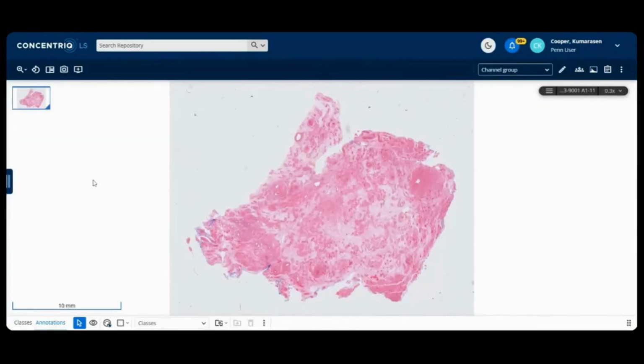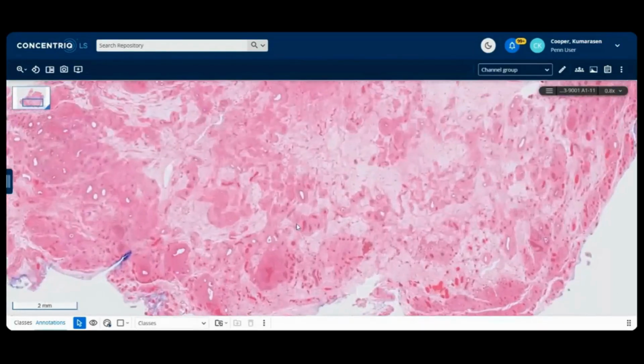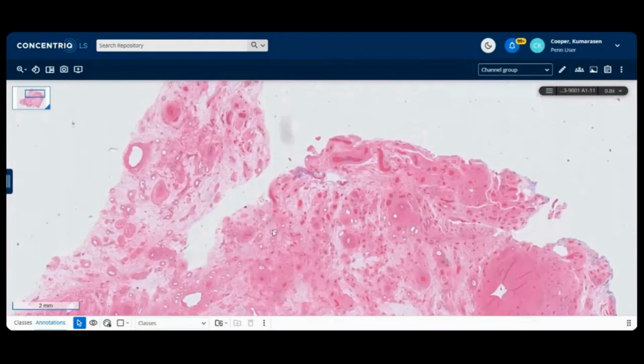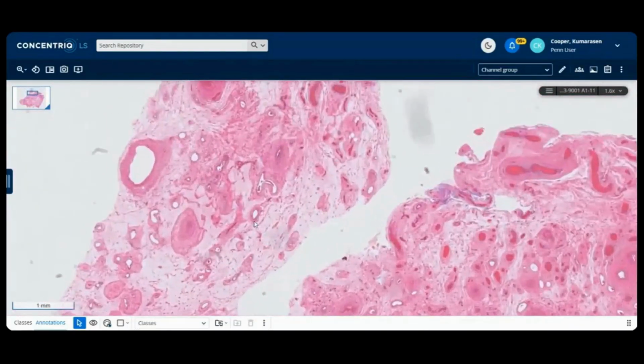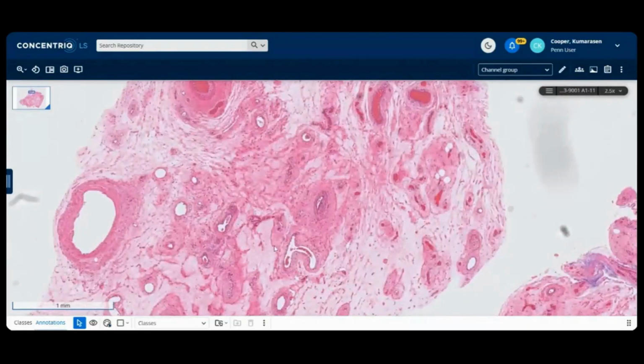All right, so this is a pelvic mass. Patient is 42 years old, and this is also 11 centimeters, so it's a pretty large pelvic mass. This section looks much better. Those dark, thick sections are difficult to deal with on digitized images, but I guess this serves a purpose and it's convenient, and it's nice to have these.